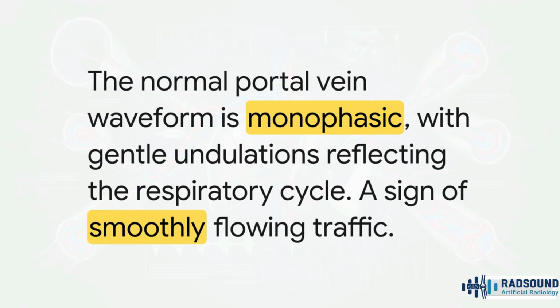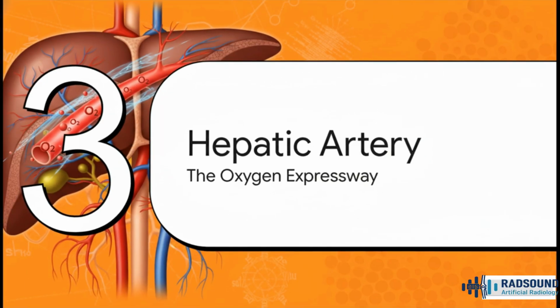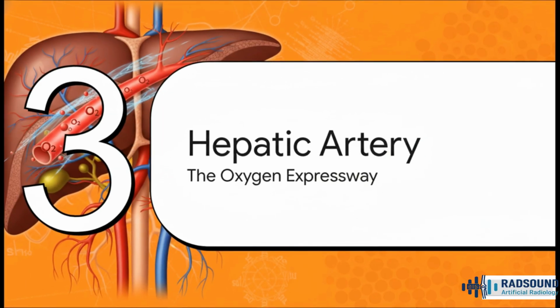You can almost think of it as the low, steady hum of traffic flowing perfectly on the freeway. Okay, on to the second supply line. If the portal vein is the big cargo freeway, then the hepatic artery.